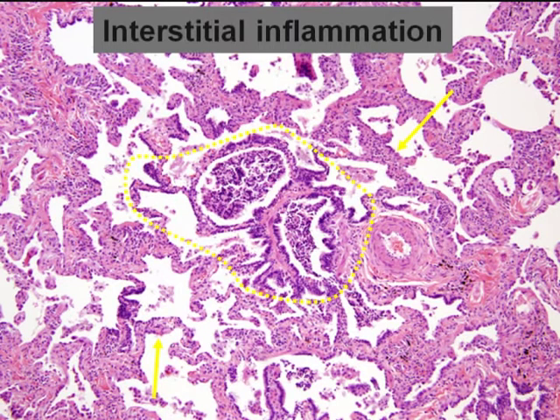And as I said, more commonly, not always, but more commonly, this represents interstitial inflammation. And when you have inflammation within the alveolar septal walls, there's the bronchus. Actually, we'll even see a little bit of lambertosis, which is bronchialization of the alveolar walls adjacent to the bronchi. But there's airway thickening with air and alveoli, and when those average between the two, you get ground glass, as opposed to a patient with dense consolidation where it looks more solid.